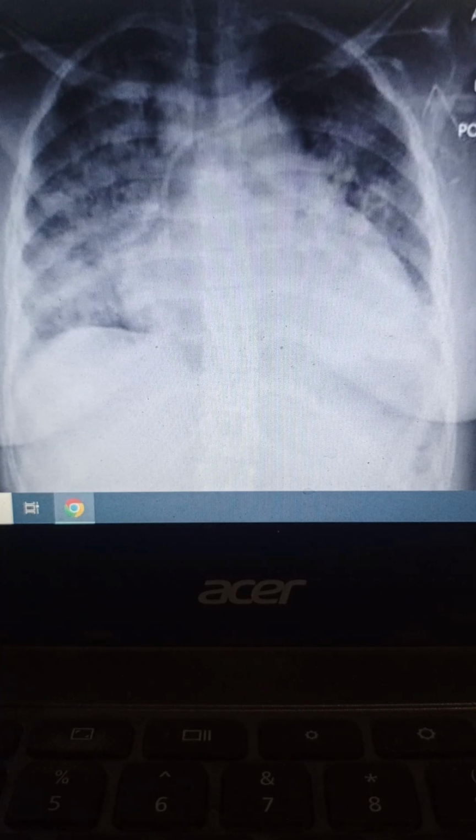And he has a history of sickle cell disease. So I am giving you a very important clue over here: a sickle cell disease history. Now can you spot the abnormality or guess the diagnosis in this patient, with reference to his history of sickle cell disease?